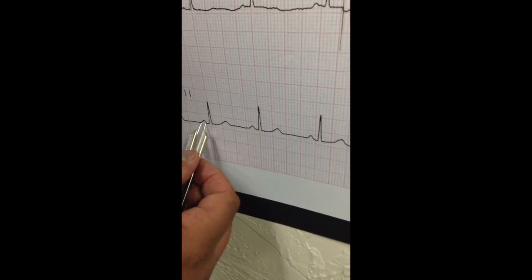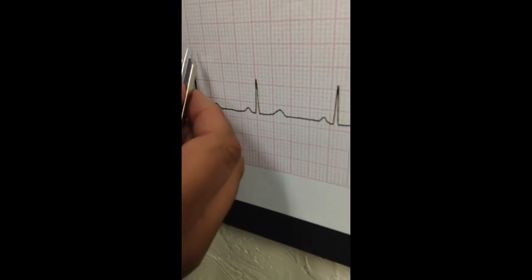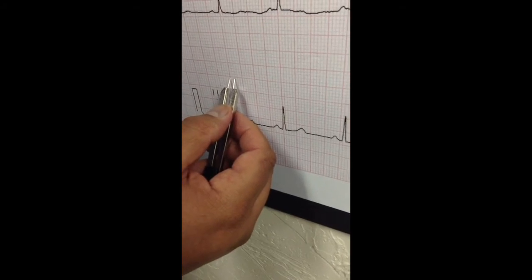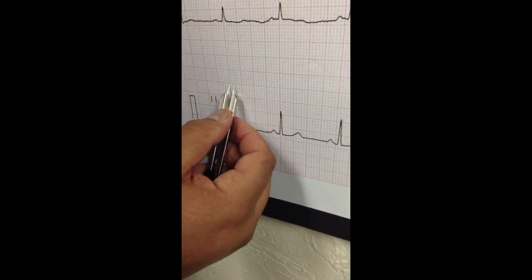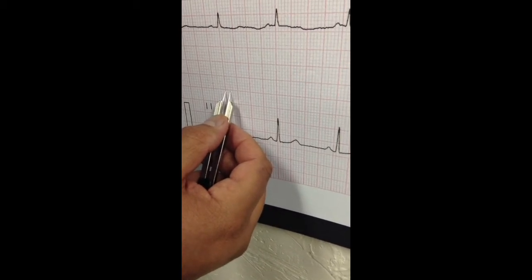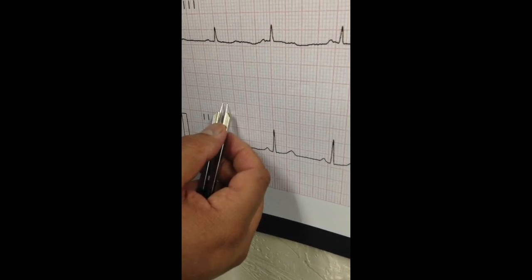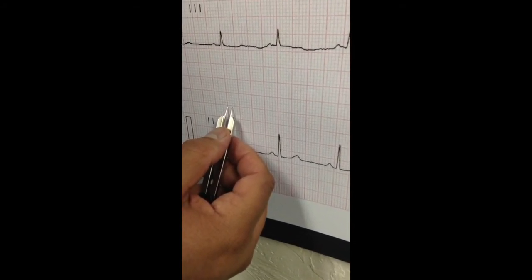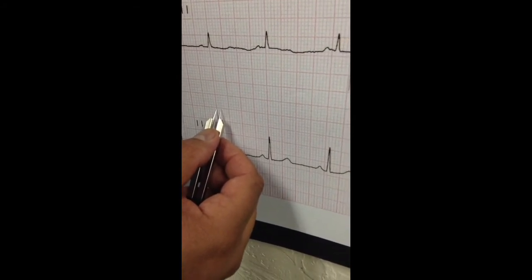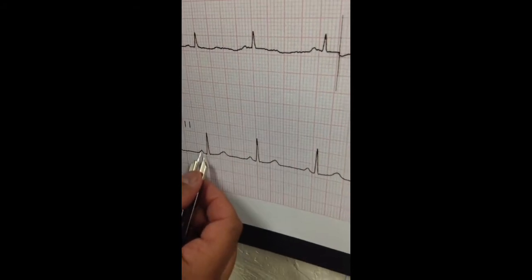Now what I want you to do at this point to measure the exact location is to take your calipers somewhere above it or below it where there's no electrical activity, and place one of the points of the caliper pin on the beginning of a strong or a heavy line, and then let the other point just sort of land where it does. And you'll notice that the P wave is exactly 2 small squares across. That's the distance of the P wave.